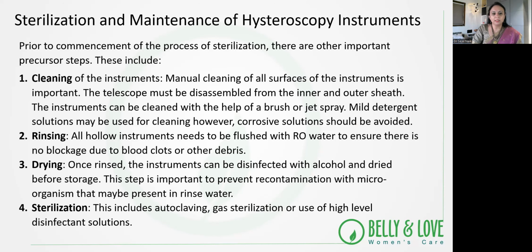Then proper rinsing and drying of the instruments, either before using the disinfectants, or at least before storing them. It is one of the important steps to prevent microorganism recontamination with the water. One can use a hair dryer or the drying air jets.